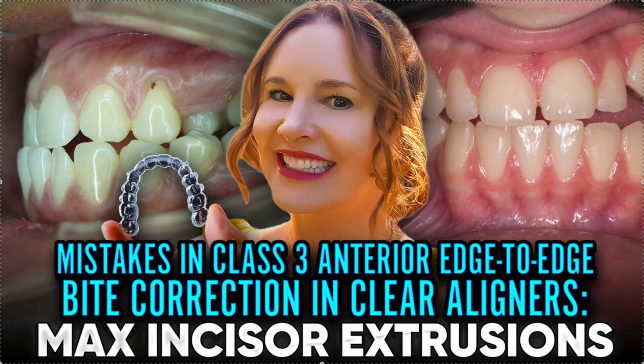Today we're going to talk about some mistakes I see in your treatment planning of those class 3-ish cases, those edge to edge. Maybe this is a more severe example. It's hard to find an image I can share that shows exactly, but there are even more subtle examples where it's just edge to edge, and it's not that hard to fix. You just need a little lower IPR to fix it.